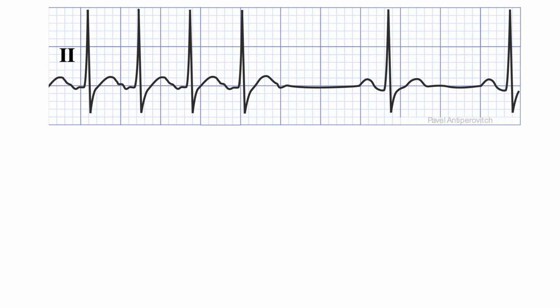This is a narrow complex tachycardia. We're given a termination and we're given 2 sinus beats. The narrow complex tachycardia has the same differential diagnosis list: AT, AVNRT, AVRT, and JT. As you can see, P waves are visible within the narrow complex tachycardia, and I can verify that these are P waves because there's a high frequency deflection on the tail end of the T wave that's not present when I template it against the sinus rhythm T wave. So these are certainly P waves. Now the interesting thing about this tachycardia is that it ends on an atrial activation, on a P wave.